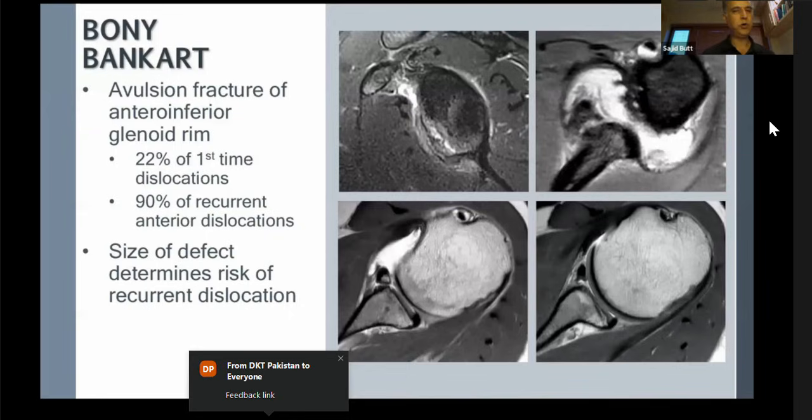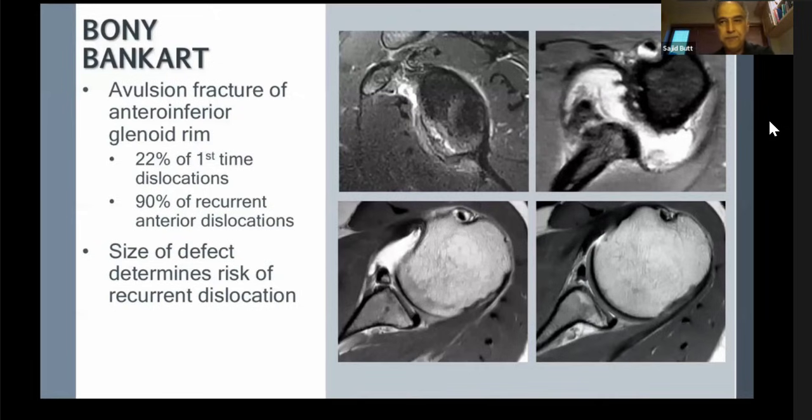I'm going to take you beyond that so that you become not just an average, but an excellent radiologist. But this is absolute passing. If you don't pick that up, you're not passing. So remember that, please. You need to try and see how big the size of the defect is, because surgeons want to know about that.